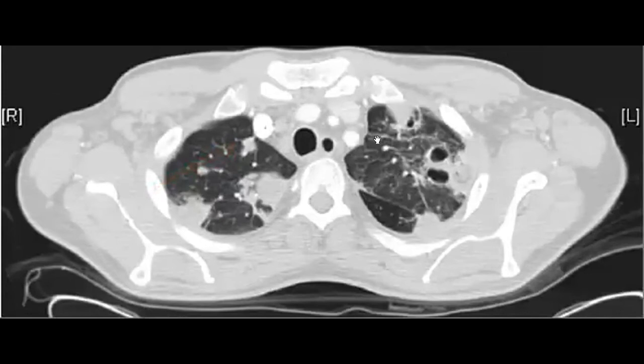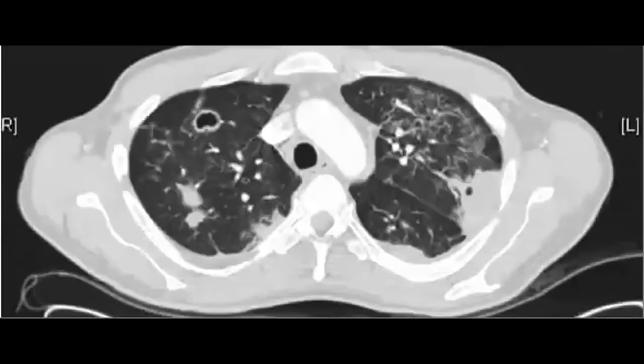Yeah, nodules, and some of them are cavitating. Perfect. This is a nice description. That's what I was waiting for. And surrounding these nodules, there is some reaction in the lung as well. So multiple nodular opacities, predominantly in the periphery of the lungs. And some of them have a thick wall cavitating lesion and are surrounded by architectural distortion of the lung. Let's look at this selected image as well. It will be the same description. And you know that most of them are pleural based. Yes. Okay.